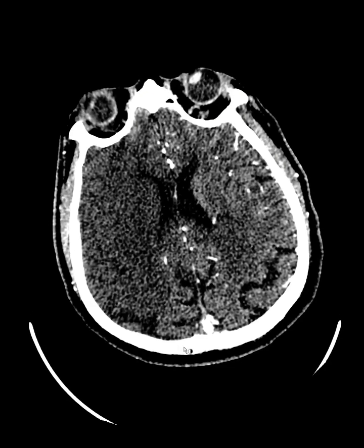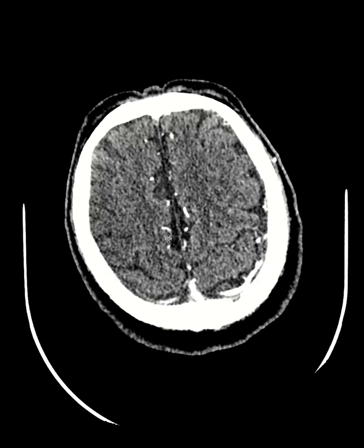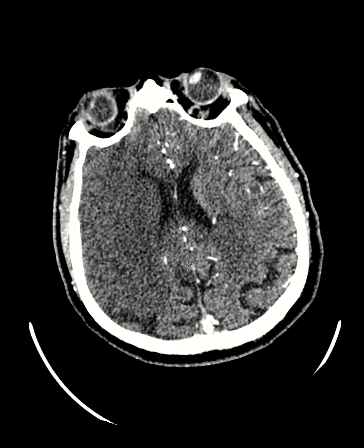Okay, so when I'm reading this, first of all, I say there is a CT perfusion deficit. There is a large area of penumbra that potentially can benefit from thrombectomy. Then I talk about mass effect, and I don't see any hemorrhagic conversion at the moment on this CT, and I don't have a large mass effect or midline shift. So basically, that's what I need to tell my clinicians about what's happening in this CTA.